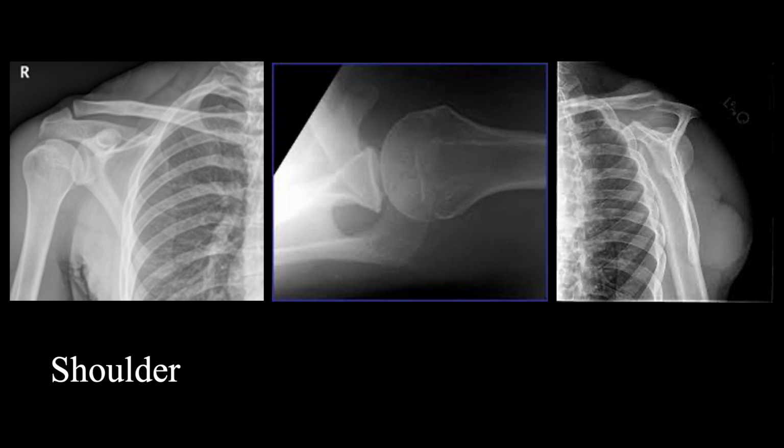And then I'll go through, and I like to start superior and work my way down. I'll just check to make sure that all of the bones that are in view don't have any fractures on them. So that would include the body of the scapula here. I like to start with the clavicle, then work my way down to the acromion, look at the coracoid, look at the glenoid. Then I like to look at the humerus all the way down, and any bone that's in view here. And then you can also look at the body of the scapula as it goes back here. Just look to see if there's any fractures. And I like to do the same, 1, 2, 3, 4, 5. And that's just how I learned how to do it.